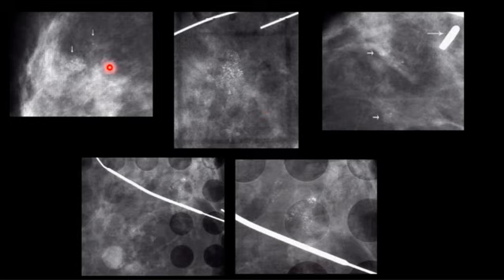This is the specimen radiograph. They saw this on a mammogram. They did a lumpectomy, imaged the mass that's removed, and confirmed that the microcalcific lesion has been removed. And at the site of the lumpectomy 5 years after the surgery, there are 2 clusters of calcifications developing here and there. So the patient came with these calcifications, they did the surgery, removed it, did an X-ray of the specimen, it was removed, confirmed. After a few years, there are 2 foci of calcification developing here and there.